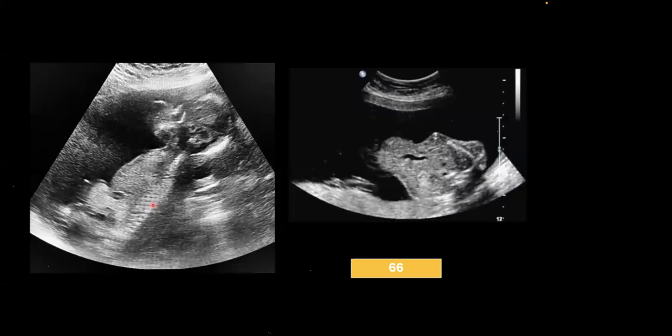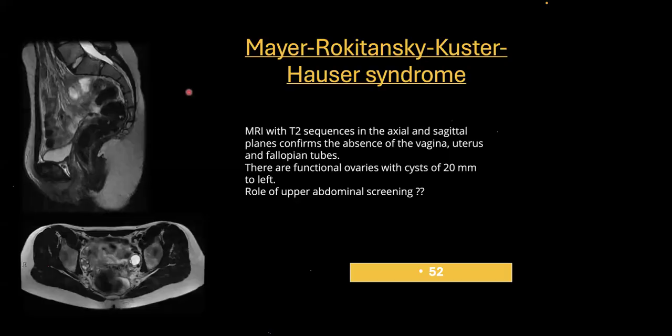An easy one. Yes, correct. So there was one more spotter before this, no? Where there was some cystic outpouching. Now this is at the abdominal level. That was at the level of the bladder. Okay, we'll come back to that. Yeah, most of you are correct. Now we'll discuss the answers.